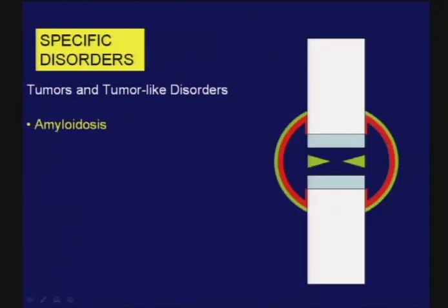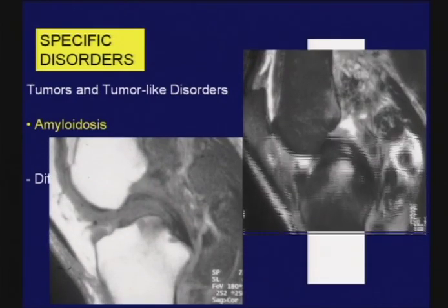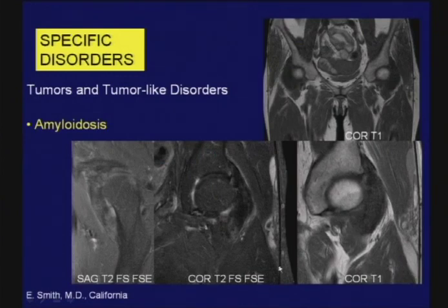And amyloidosis, which we have seen in patients on chronic hemodialysis, leads to deposition in and around joints. This is one of the tissues that has persistent low signal, here's a lot of it in the back of the knee, on even the fluid-sensitive sequences. This tissue may also infiltrate joint capsules and tendons. This is a characteristic appearance of what amyloid deposition looks like around the hip. It was bilateral in this case.